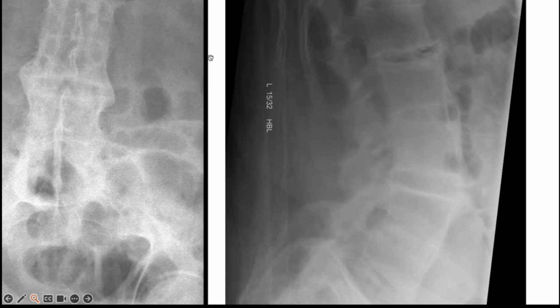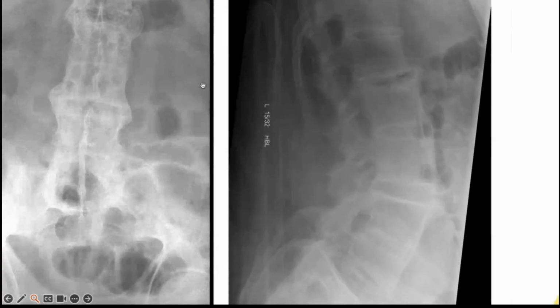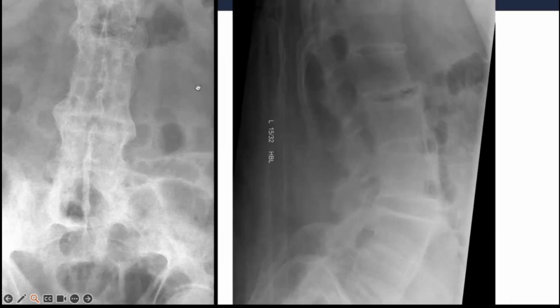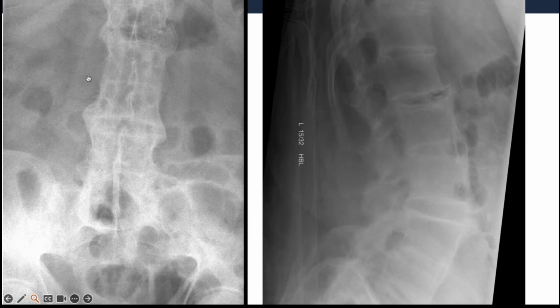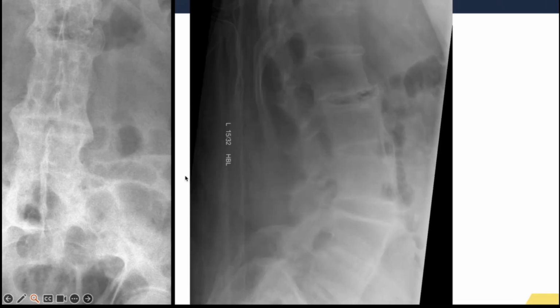Yeah. So this thing about the discs and the osteophytes, what are we looking at there? What type of osteophyte are you seeing on that lateral? Where is that osteophyte? Is it thin? Is it big? If we look at every single disc, I was looking more on the AP, so I was looking sort of on the lateral aspects of the vertebrae, but those are there too. Yeah. Okay, so if we go to the next slide.